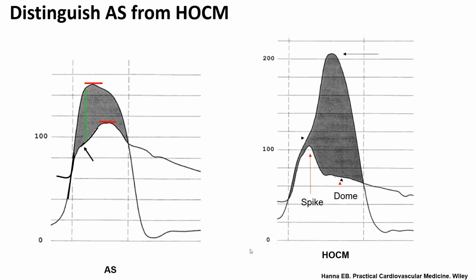What happens, the LVOT obstruction is dynamic, and it worsens throughout systole as the LV shrinks and becomes smaller, which explains why you have late obstruction, late gradient, a late drop in aortic pressure, and a late peaking of the LV after an early bend. You will have a bend on the LV, not on the aorta in the case of HOCM. And the more severe the dynamic LVOT obstruction, the more pronounced that morphology will be, the more spike and dome it will appear.